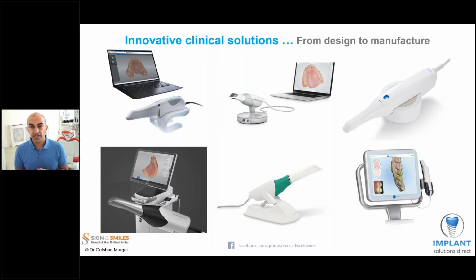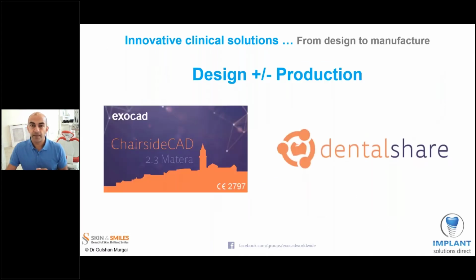So you can see here scanners from Planmeca, from Sirona, Carestream, 3Shape, Align Tech iTero, and of course Medit as well. Now moving forwards, when you have the capability to do design using ChairsideCAD, you have the option of whether or not you want to invest further into manufacture as well.